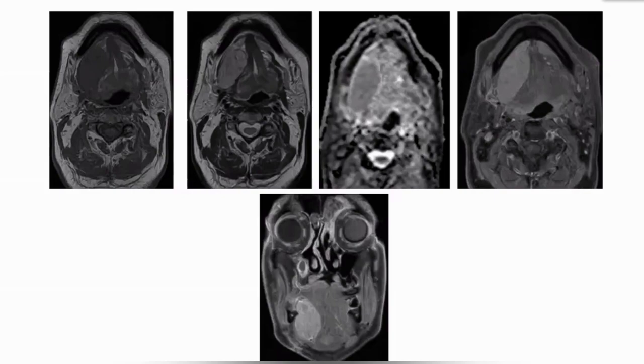So it is showing homogeneous contrast enhancement, with well-defined lobulated margins, extending up to the angle of the mandible posteriorly, and causing slight midline displacement of the muscle compartment.